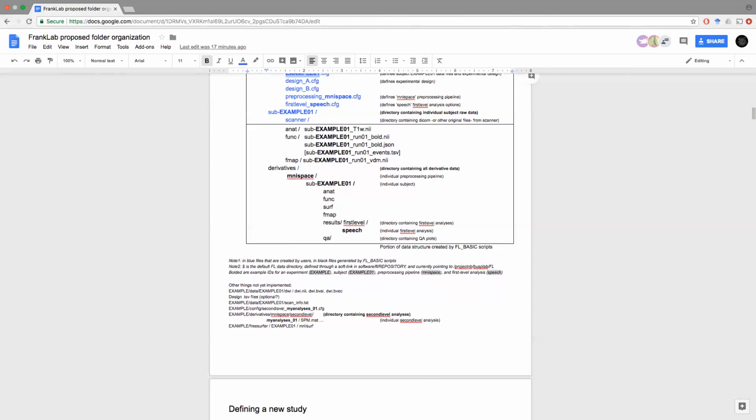I think the T1 would already have the intensity normalization step applied. Right, you mean the orig? I see what you mean. You have an orig file, which is the original one, and then you have the T1, which has had a number of individual steps applied, like this intensity normalization and things like that, right? Right. I don't know why I like the T1 better, but I haven't done enough testing to confidently say that one will be better than the other.